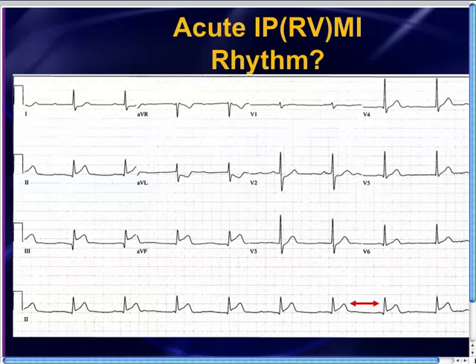Well, we've already established that, and I'm going to put an A there, there is atrial activity going on, right? And the atrium is beating in the 90s or so. We'll just say that there's an atrial rate that's going in the 90s. And remember how we defined sinus node activity? It's got to be upright in all of the limb leads except inverted in lead AVR.